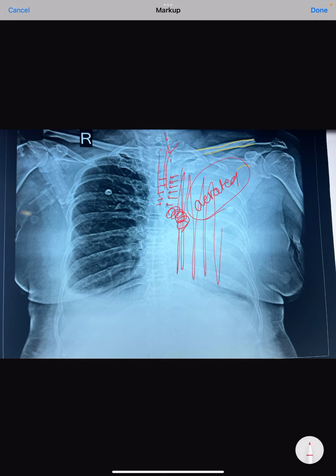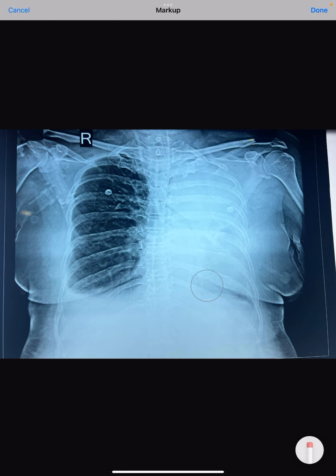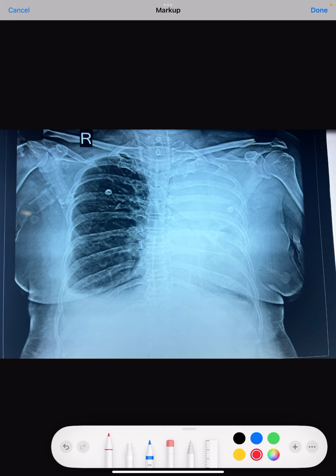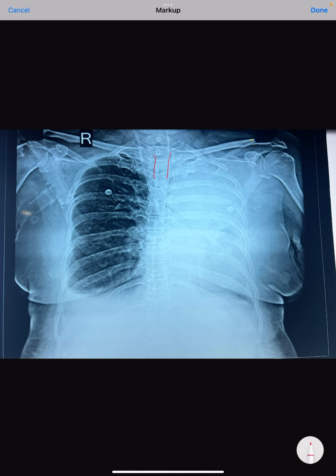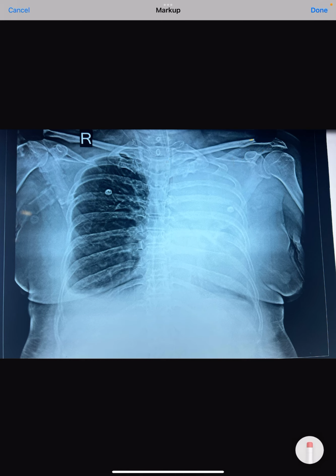So sudden onset of this whiteness or radio-opaqueness of the lung with worsening of the saturation or oxygenation clearly tells us about lung collapse. The treatment is very simple. You simply remove the tube, or you just pull the tube outside by around 2 to 4 centimeters. It will give space for suctioning of the mucus. And if it is not possible, then bronchoscopic removal of the mucus plug helps and can completely cure this problem.